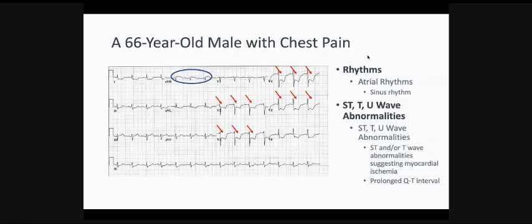If you find an ST segment depression, then it's either an ischemia or a reciprocal change of an ST segment elevation anywhere. So if you find no ST segment elevation in any other lead, then this is a clear ischemia. And once it's an ischemia, you cannot mistake that, because it has this ugly looking ST segment depression.